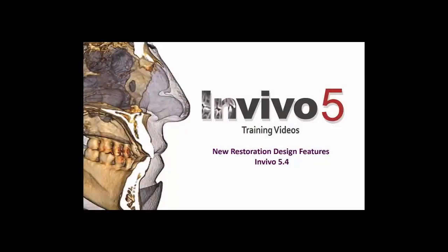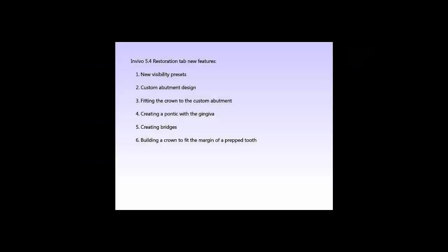Invivo 5.4 has several new features in the Restoration tab to help you produce better results for your patient. These new features include new visibility presets, custom abutment design, fitting the crown to the custom abutment, creating a pontic with the gingiva, creating bridges, and building a crown to fit the margin of a prepped tooth.